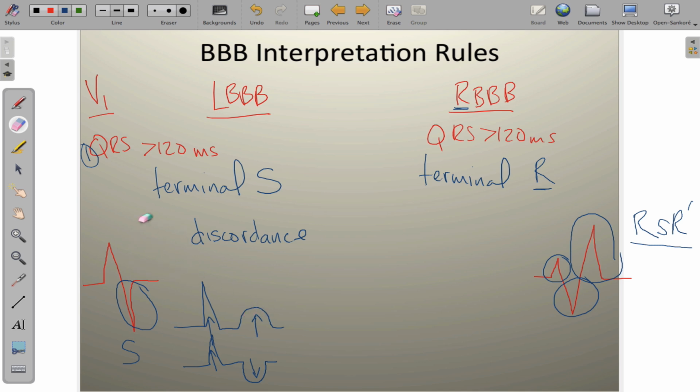This is kind of an important concept because in bundle branch block, we have a concept of appropriate discordance. That is to say, in bundle branch block, something that you'll find is that the QRS and the T wave will oppose forces, and that's a normal thing. That's an appropriate discordant pattern. And you'll find this pattern of discordance in leads 1, AVL, V5, and V6.